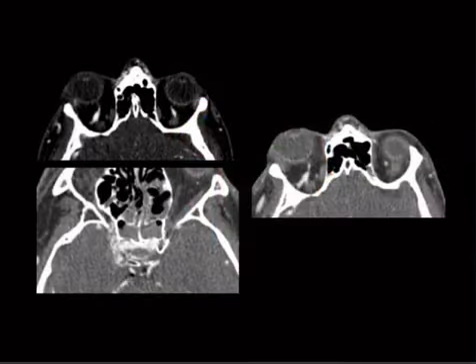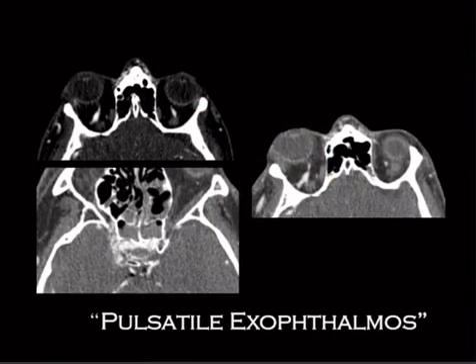All right, another trauma case. Just going to point out some findings here. First, I'm going to give you the buzzword, pulsatile exophthalmos. That's a buzzword that's specific for this entity. You can also see it in NF1 with the sphenoid wing abnormalities. They supposedly can also get pulsatile exophthalmos, but in a setting of trauma, this is a dead giveaway.